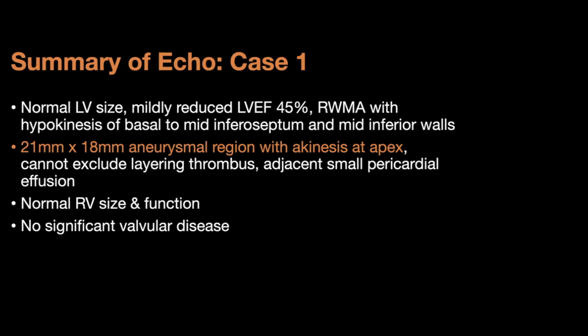I guess just to give you some backstory, this was initially seen around 6 a.m. by the cardiology residents on call and picked up at bedside. Then they got an echo around 8 a.m. This gentleman did not really speak English. There was at least no chest trauma, which is what they were worried about. Based on the ECG, people were worried this was maybe a myocardial infarction with late presenting mechanical complication, but otherwise we talked about all the pertinent findings here.